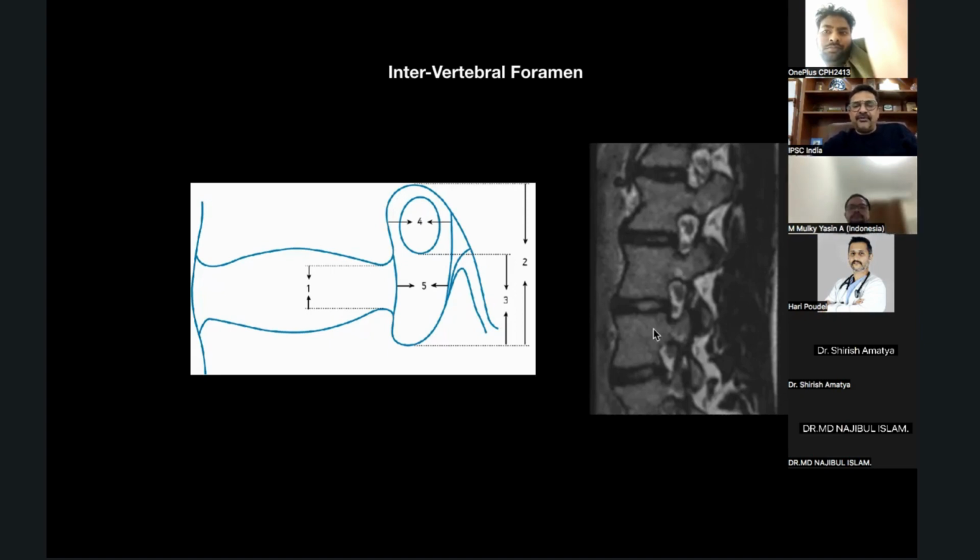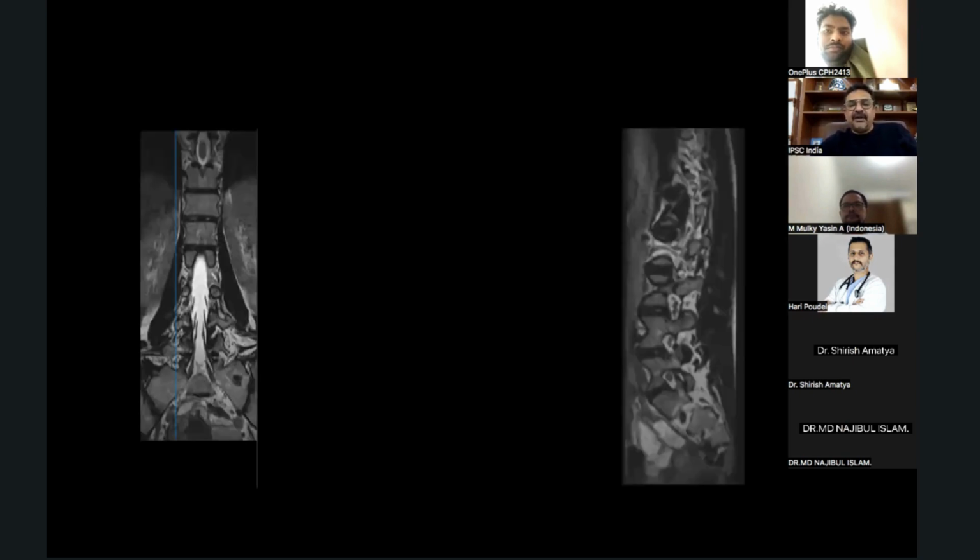We have all the bony margins around this, and you can see them clearly on the MRI. So if there is any foramen herniation, we can see it on the sagittal sections. We see them from the extraforaminal area, and then we start going towards the foramen, then the paracentral area, then the central area, and likewise we can go to the other side and see the entire roots.